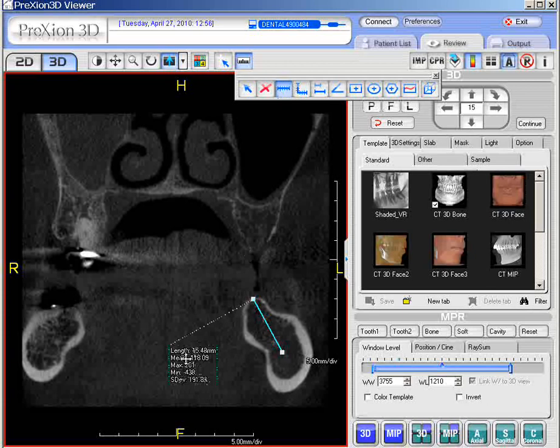the distance. Okay. If we left click it once, we have a dotted line that connects, and notice the box is color coded on the outer periphery as well. So we have a selection for distance and length. We can also measure the cross section or width. Again, pick a section. In this case, I'm just measuring from the cancellous leading edge to leading edge in the cancellous region. So I'm going to left click it, drag, and I get to the other edge of the cancellous bone. I'm going to release it, and now we have the length for the cross-sectional measurement. Okay, so that's how you can quickly measure for distance.